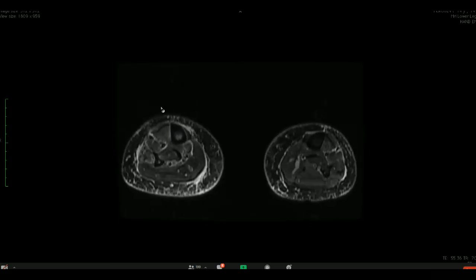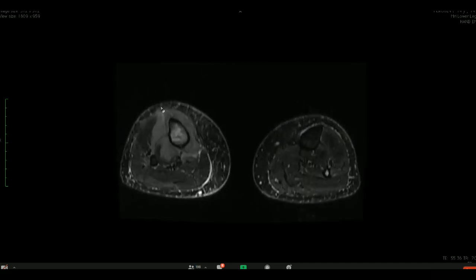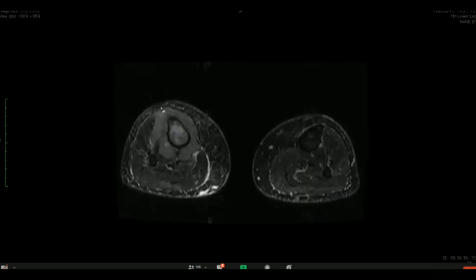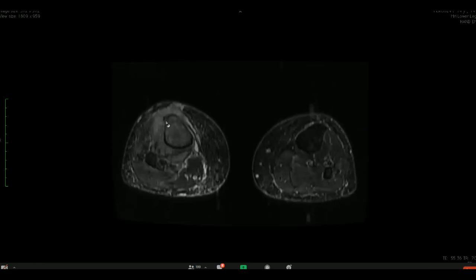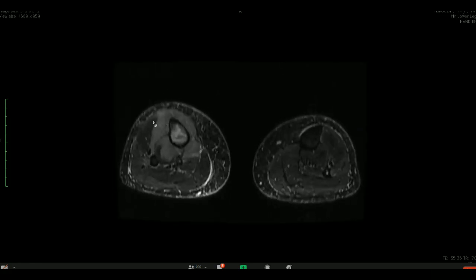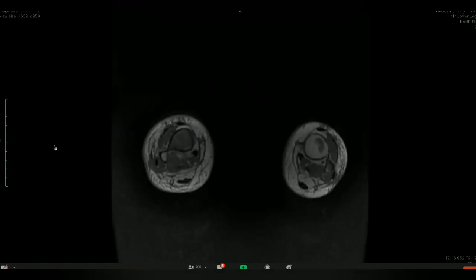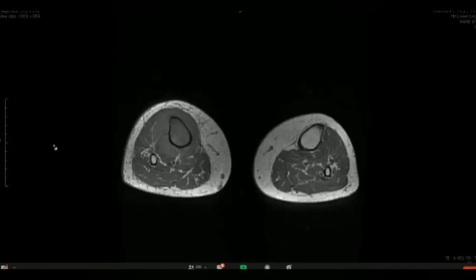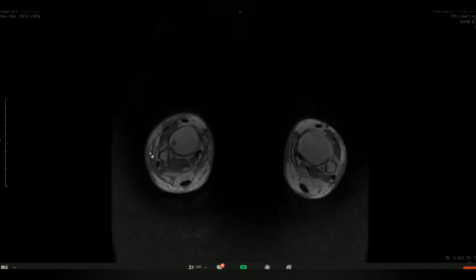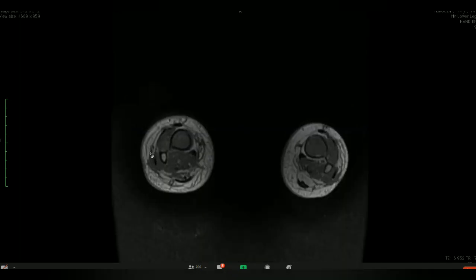than metastatic deposits. Metastatic deposits can present with extraosseous soft tissue disease, but we work in a large oncology center and soft tissue tumor center, and we don't see metastatic disease with a large soft tissue component unless the patient has got a fracture, or there's hematoma there. When we see something like this, we are always concerned about a lymphoproliferative disorder, but metastatic disease remains a differential.